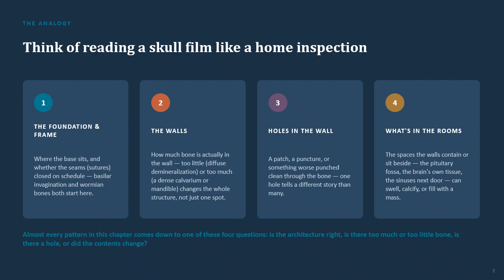So these are the areas where bone has actually been destroyed. And when the bone is destroyed, remember, one hole versus multiple holes. When bone has been destroyed, it's going to create or leave some sort of vacancy or a hole. All right, so if there's one hole or multiple holes, it will point to, lead, direct, or guide, or give a clue as to what is causing that condition. So the patient's diagnosis is what we're looking for here.